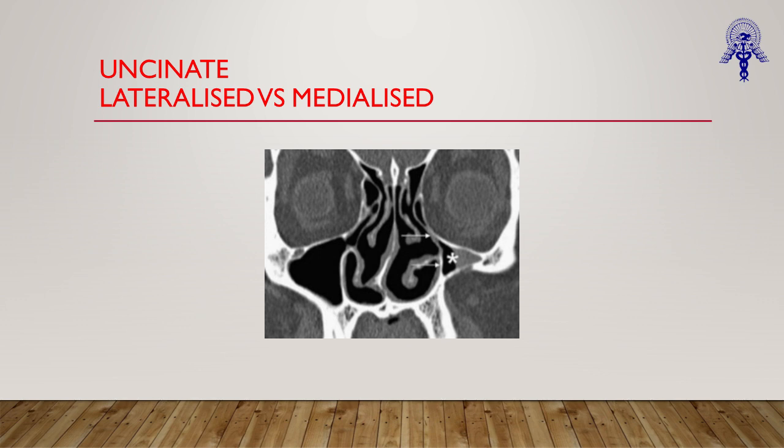Now, what is the importance of understanding this? The uncinate process here is very normal, as we said in the other scan, and the infundibulum is very wide. Here the uncinate process is lateralized and touching the lamina papyracea.